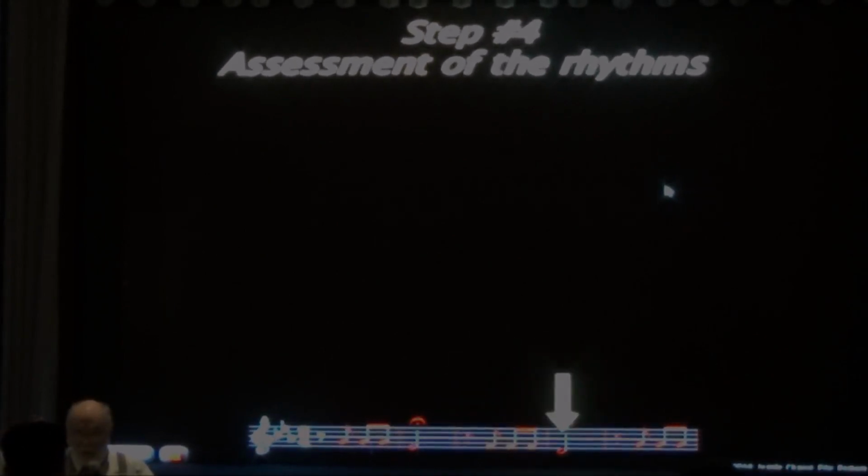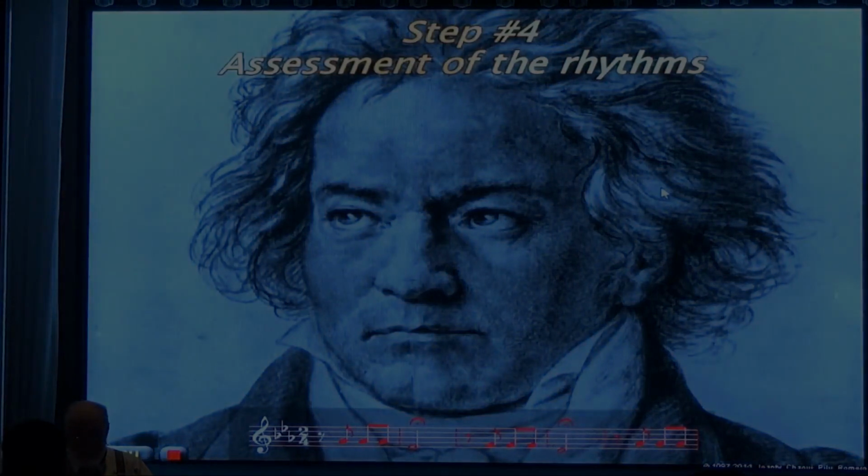I don't read music either, but you can see that you have 3 of the same level, and then one goes down. And then you have 3 of the same level, and then one goes down. This is the Fate motif, 5th Symphony of Beethoven. I was in Petersburg in Russia, and one of the women not only said the 5th Symphony, but she could say the 5th motif. The reason I want to show that is that a very simple tracing carries a lot of information.